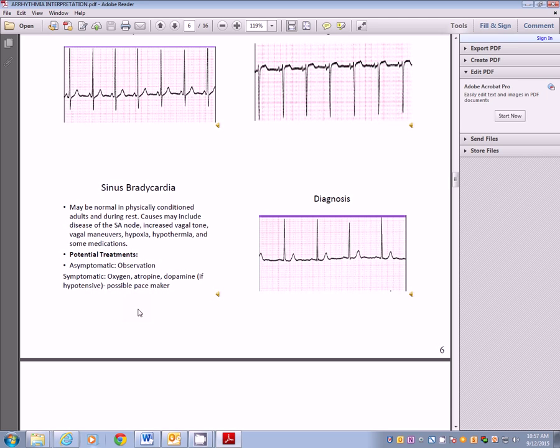So let's look at this characteristic strip. We're going to go back to our little handy dandy sheet. Identify the P waves. Are there P waves? Very small P waves, aren't they? I mean small P waves. But they are the same, and they do look the same before every QRS complex. QRS, QRS, QRS, QRST, QRST. So it's all there.